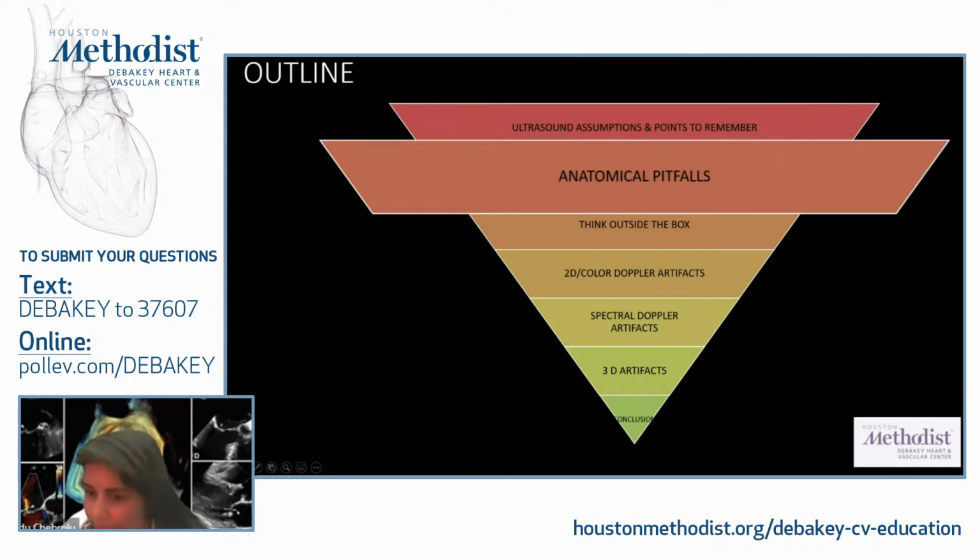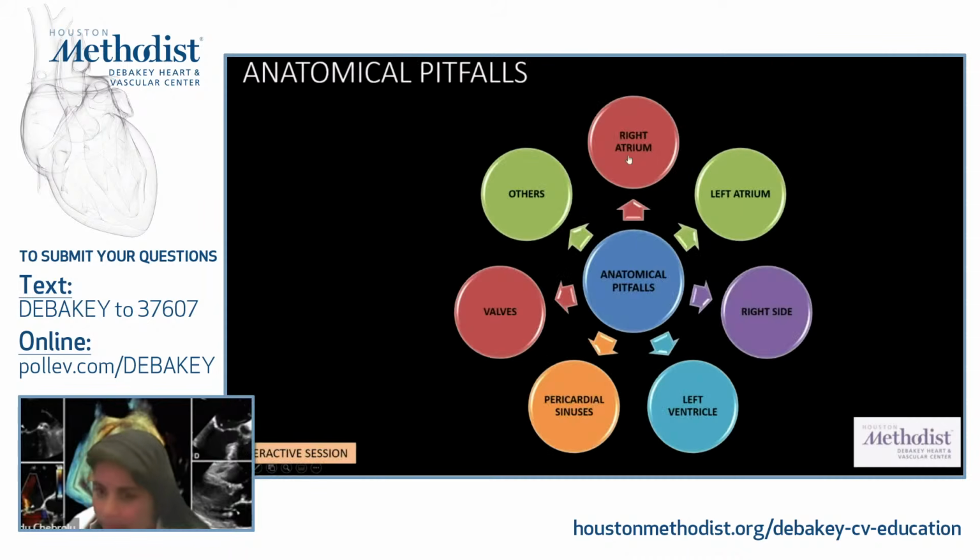Let's move on to learning some of the anatomical pitfalls. Let's try and see if we can keep this interactive. All right, let me see who the participants are today. If any takers, do you want to start with something, any of these categories? I know we are in a virtual environment. I'm going to make this easier. Maybe I can start off with the right atrium. Let's see if some of our fellows are logged in to answer these questions.